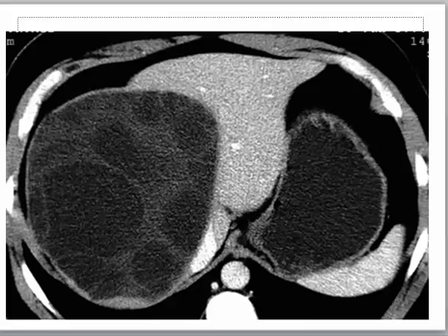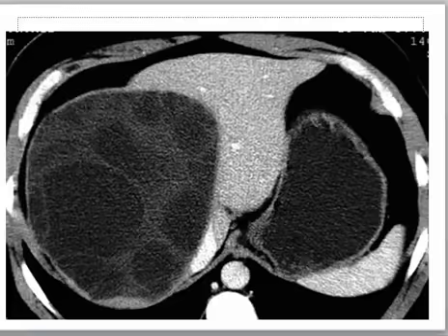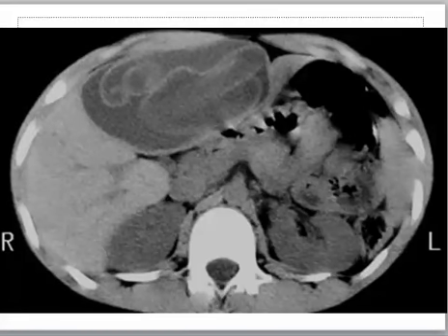This is a typical example of a large cyst with multiple septa and multiple rings inside. It is a hydatid disease. It's another example of a hydatid disease with separation of the germinal layer from the cuticular layer of the host, and thus a large irregular cyst is seen. It is similar to the water lily appearance of hydatid disease of the lung, ruptured hydatid of the lung.